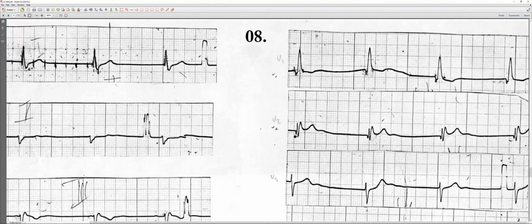Because? It's the, what do you call it? Infarction. Yeah, but why did we say this is pathological? Because basically this is not 1/4 of the R wave. But we do see Q where we should not see Q. V2, okay. And this is why any small q can represent an MI.